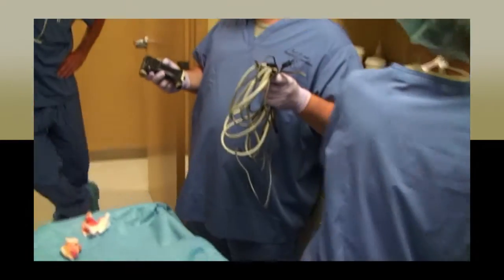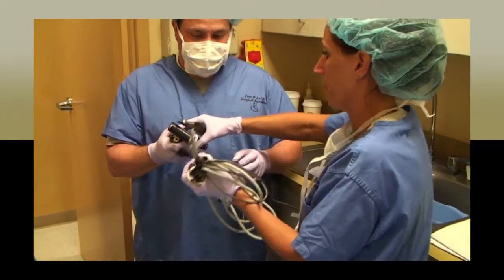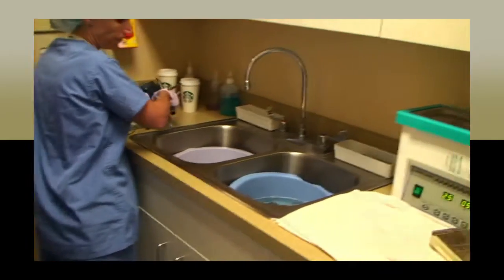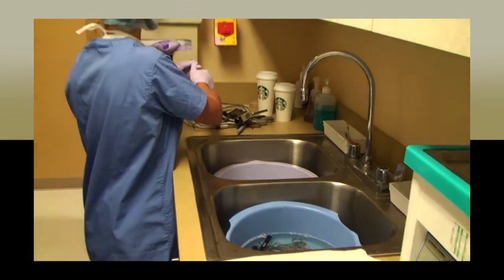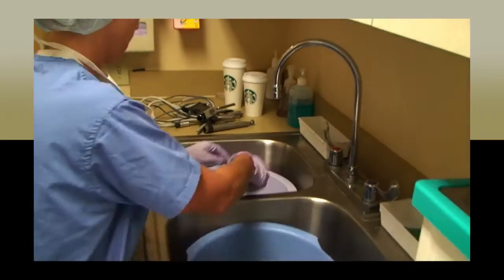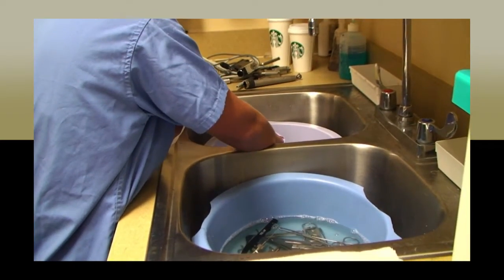Because equipment is very expensive, and the surgery center does many cases per surgical day, there are not enough full sets of instruments for each individual case. Instrument sets must be cleaned and re-sterilized in between cases. We use 3 main instrument sets. However, during a full surgery day, there could be anywhere from 8 to 13 surgical cases. This makes it necessary to have a circulation assistant to ensure each case has the instruments necessary.